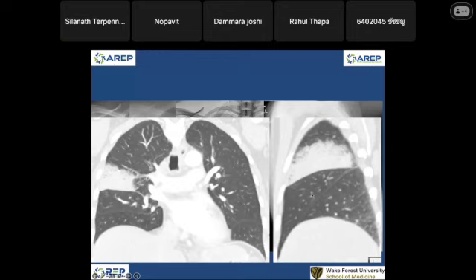Normally the usual pneumonia, we call it lobar pneumonia, so it will be confined to one lobe only. It will not cross the fissure and go to the next lobe because there's no connection. The fissure is a natural barrier between lobes. Once you get trouble in one lobe, it will stop. It's almost like a big barrier between two lobes, so the infection will not cross that fissure.